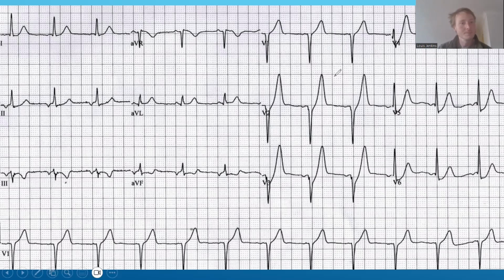So again, looking at the forest, this ECG looks off to me. There's a few things that really stand out, like those massive T waves in our precordial leads, the fact that everything's pointing in weird directions in our inferior leads. And yeah, definitely going to want to have a really close look at the trees. So starting with our high lateral leads, that is.